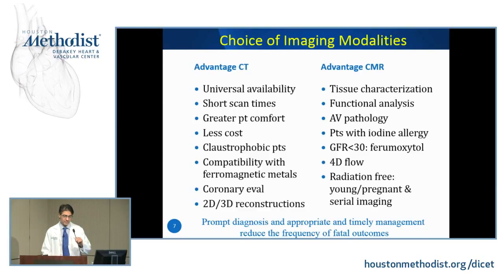Now, when it comes to CT and CMR, both of them are excellent anatomical tests. A lot of my talk will be spent showing probably three-quarters CT images and one-quarter CMR images, not because CMR is at all inferior in imaging. It's just what I could quickly acquire. To be honest with you, the images by CMR look exactly the same as CT, so consider them equal. So how should you choose who should get which test? We'll be going into that a lot.